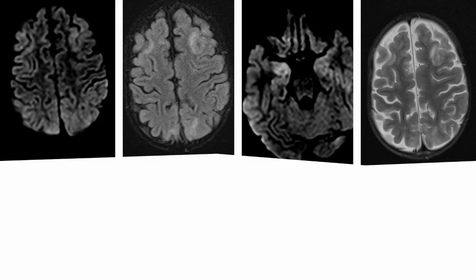This is a companion case of an 8-year-old who was admitted post-bone marrow transplant for an underlying hematological condition, and essentially was experiencing some altered neurology with reducing GCS. The team were concerned of an underlying bleed, potentially an infarct. They also recorded some EEG epileptogenic activity, and the MRI revealed that there were bilateral regions of T2 FLAIR hyperintensity, which were along the internal watershed or border zone region.